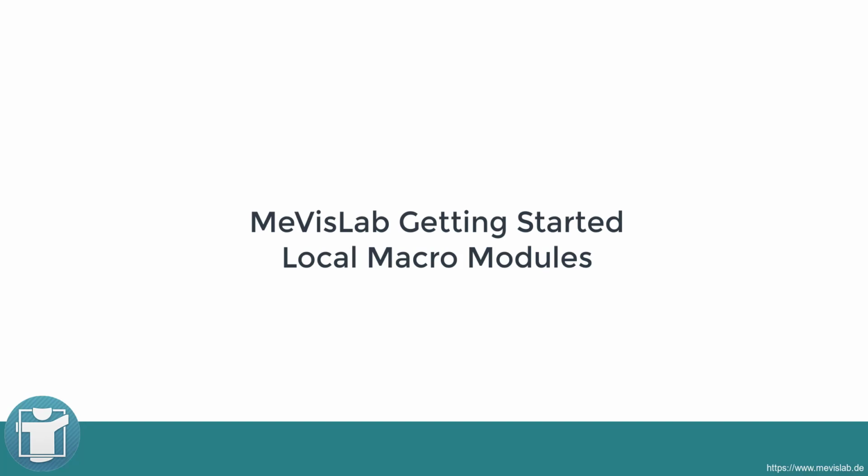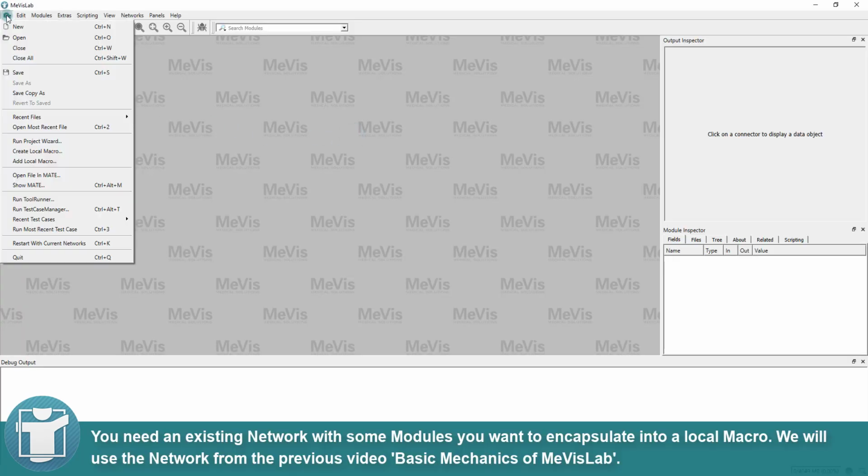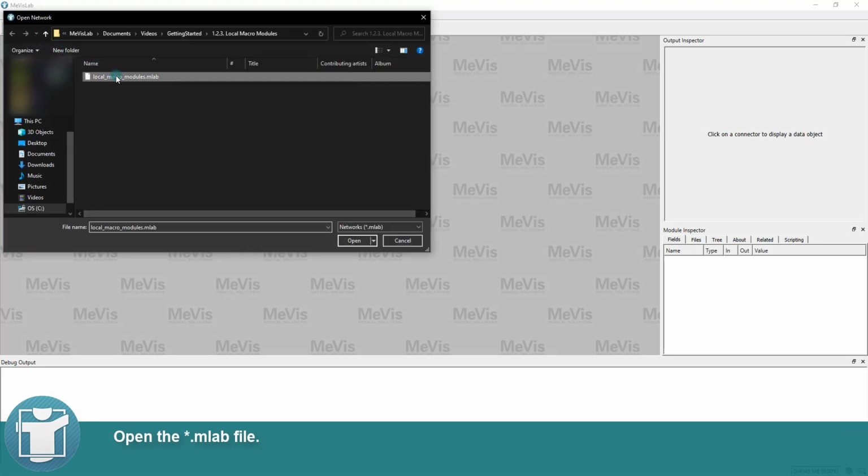In this video, you will learn how to create local macro modules and see what they can do for you. First of all, you need an existing network with some modules you want to encapsulate into a local macro. We will use the network from the previous video Basic Mechanics of MeVisLab. Open the MLab file.